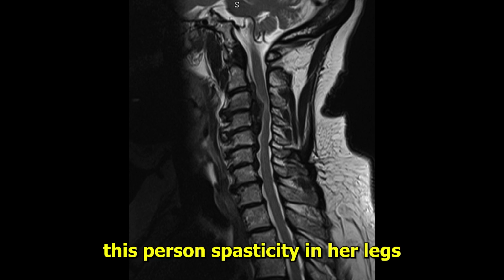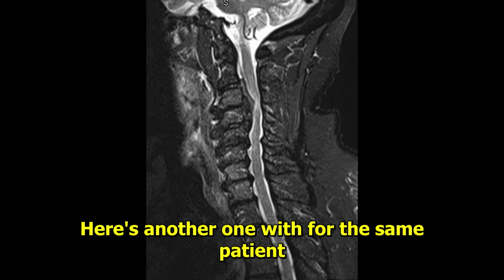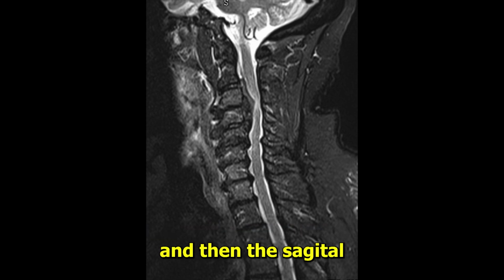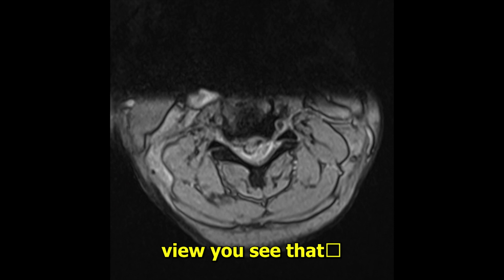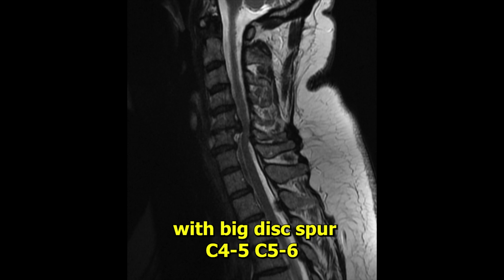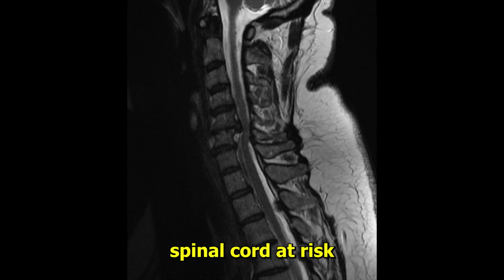This person was spastic in their legs, severe spinal cord compression and a contusion. Here's another one with the same patient at C3-4 that shows the stir sequences of the contusion. And then the sagittal view, you see that spur right in the center smashing the spinal cord flat. Here's another one, a big disc spur C4-5, C5-6 with distortion of spinal cord at risk.